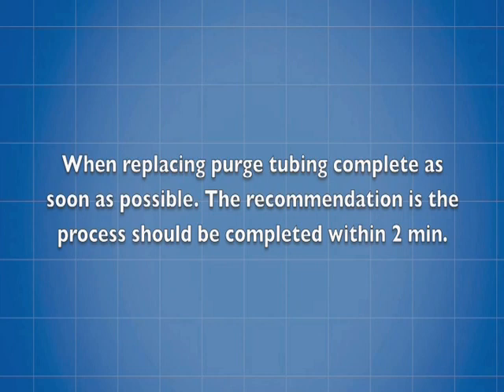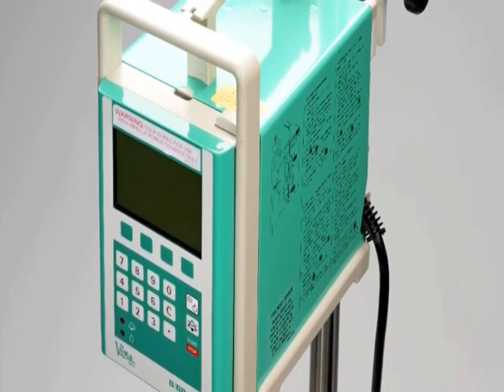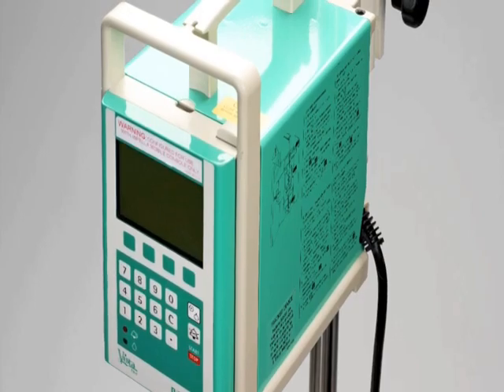When replacing purge tubing, complete this operation as soon as possible. The recommendation is the replacement process should be completed within 2 minutes. Refer to the instructions for use for a complete list of warnings and cautions.